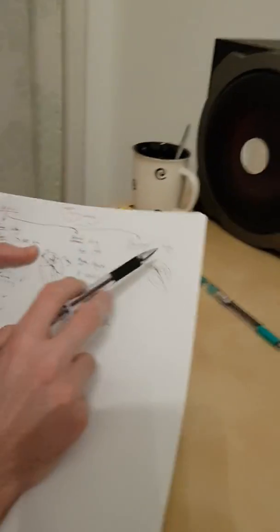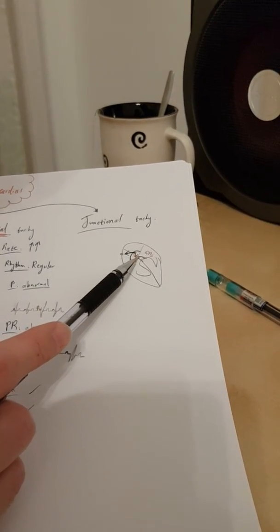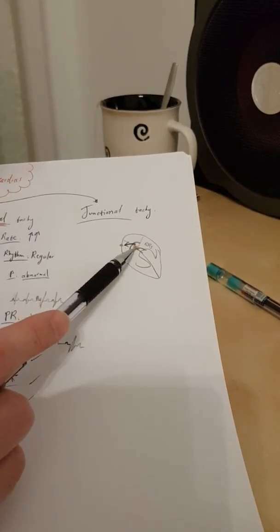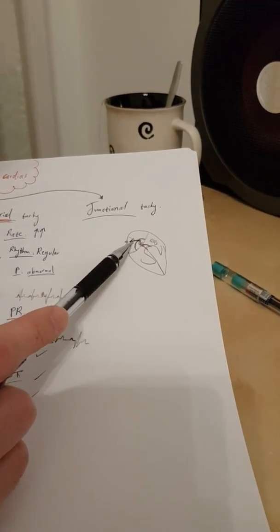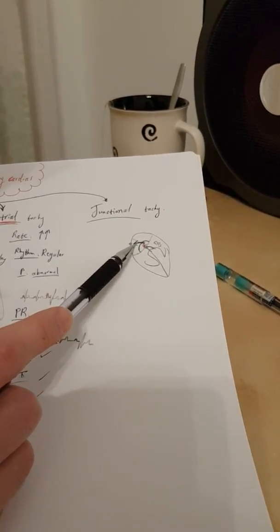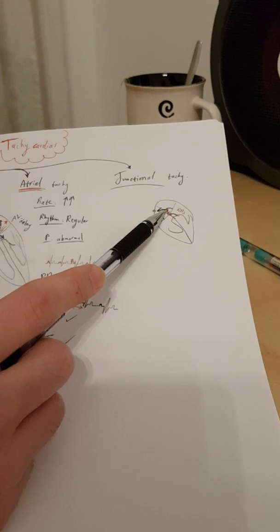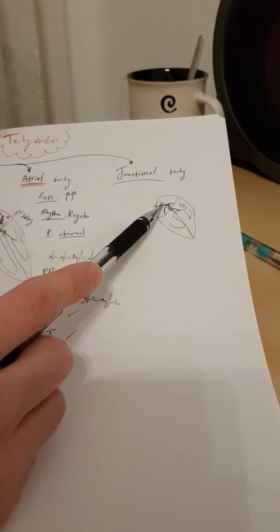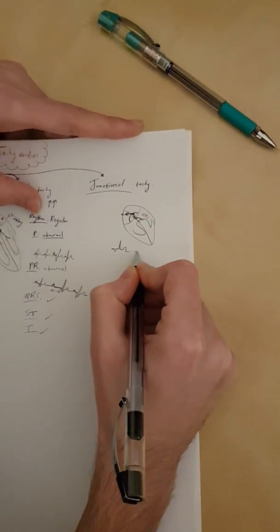Now, here's the thing. The black one and the red one. It doesn't mean that you will always get a QRS first and then a P just because this is closer here and further there. No. This can be faster than this. So if this is faster, it's the tract that is up, sorry, up the ectopic focus, this one. So if it's the one up, it's supranodal. Meaning, in this case, if the black one is faster, you will see an inverted P wave, okay? Then QRS, then a T wave. And this is supra.